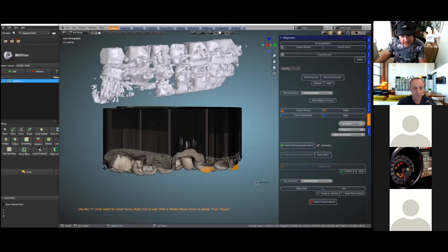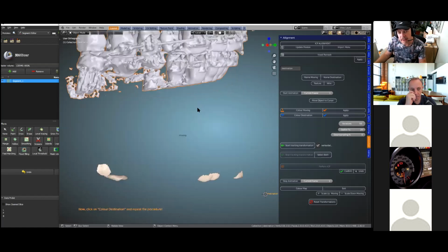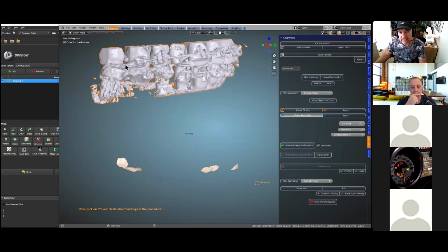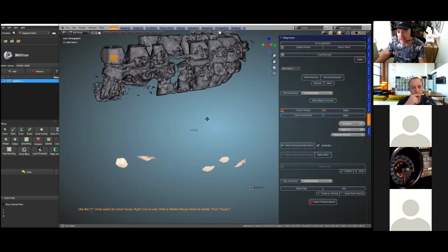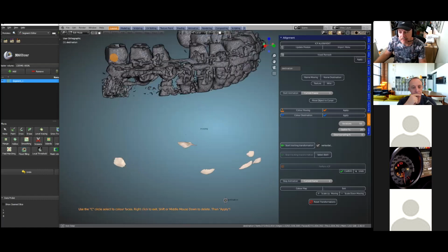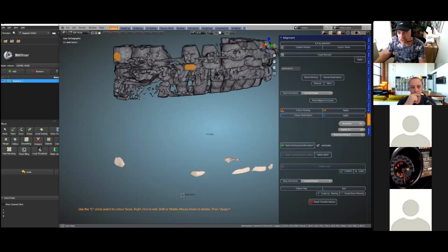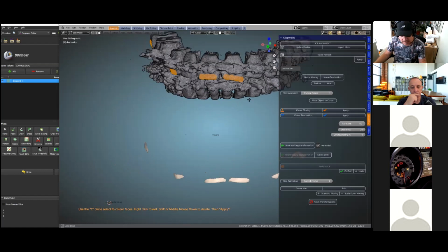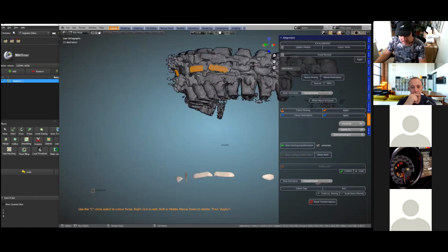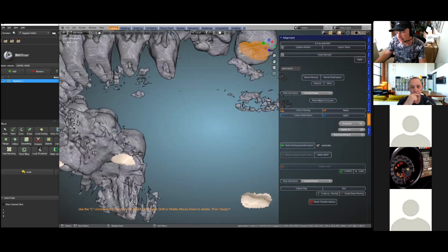Maybe I can put a dab across there, apply that, and then this, we're going to color destination, and we're going to do the same thing. Little dab there. Make sure that you don't paint anything else but what you have selected. And then a splotch over here, like that. And we're going to apply this.